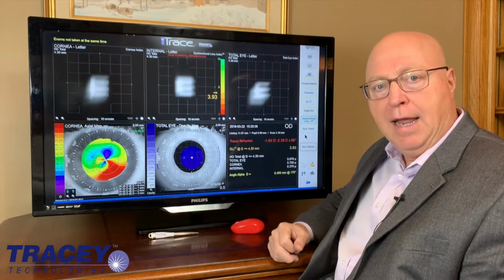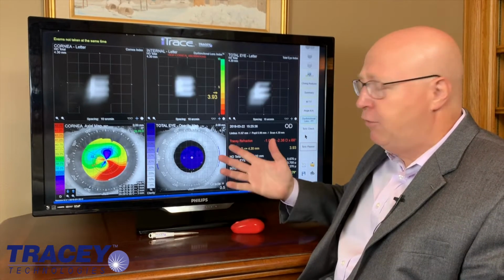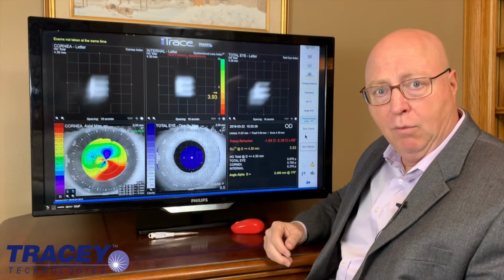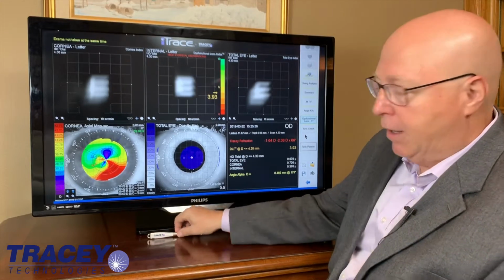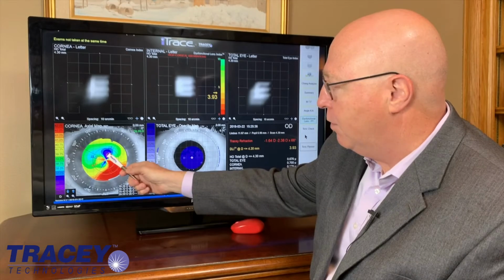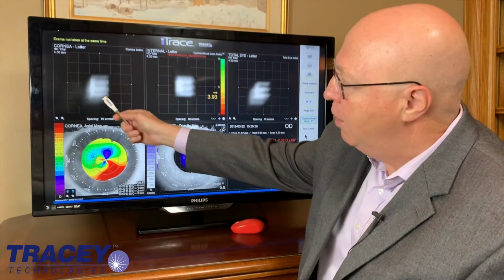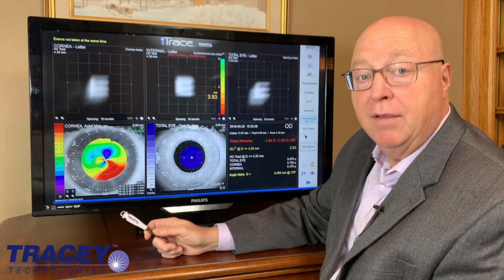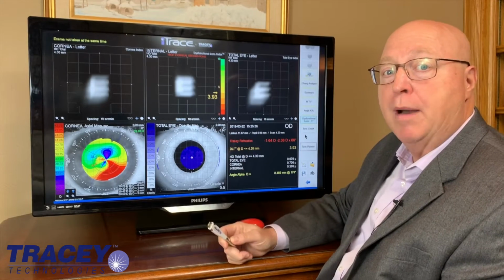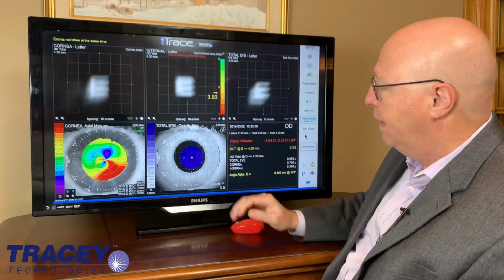This is a 38-year-old female ophthalmologist I met in my travels. She came in and said, "Oh, I have pretty good vision," but I mapped her. And I said, "Wow, I don't think you do." Let's look. A history of prior refractive surgery, a very decentered LASIK with a flat spot here and a very steep spot here. And her cornea, as you can tell, is not very good. This is best corrected. And her DLI is also low because there's a lot of high order aberrations as the lens tries to compensate for the crazy cornea. And so her total vision is not good.